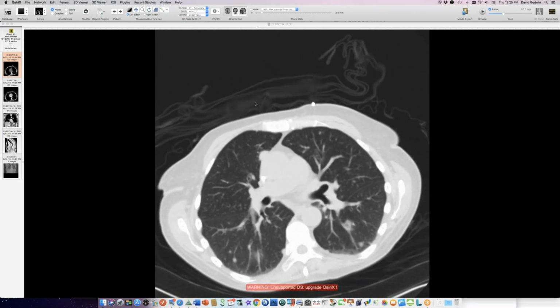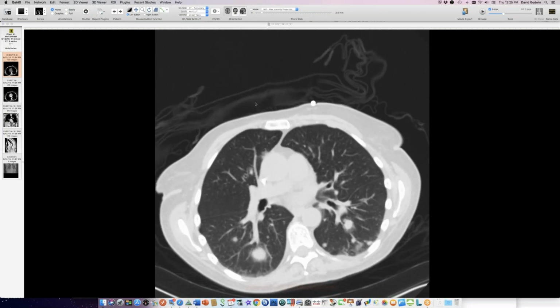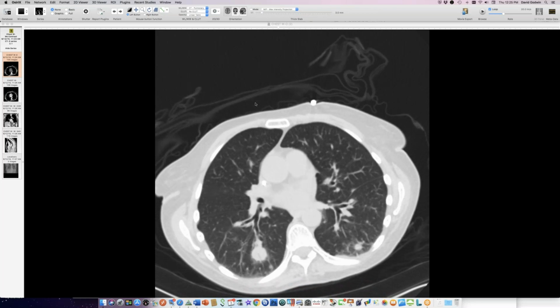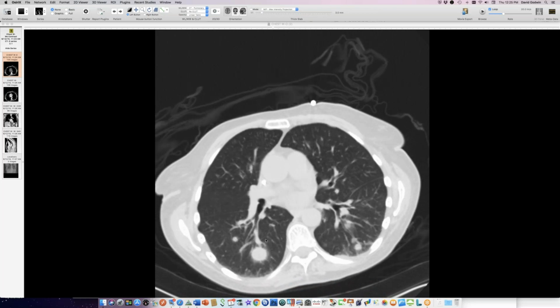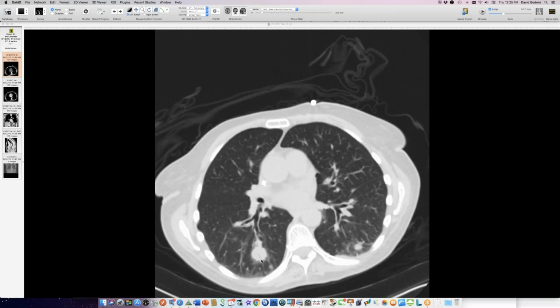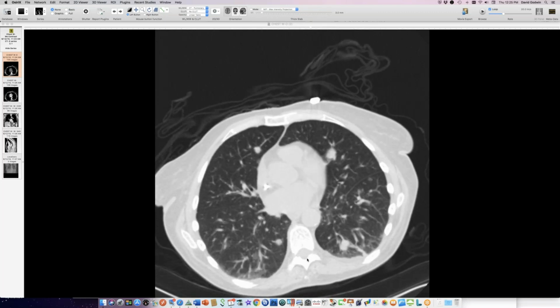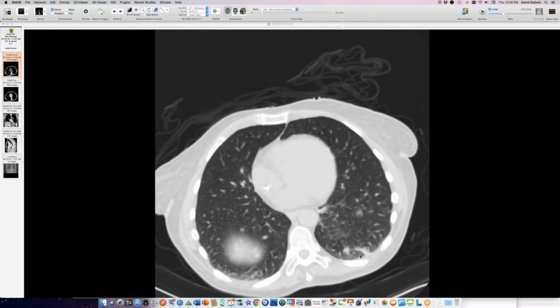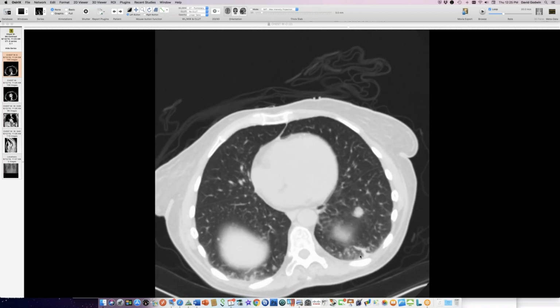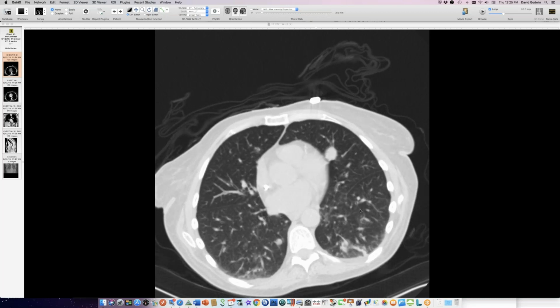that shows these nodules. And the first consideration for somebody who is immune compromised by Rituxan and other things would be fungal infection, but these really don't look like fungi in terms of their basal predominance rather than their mid-lung predominance. The associated air bronchograms, the large number of lesions here, the fact that some of them are getting fairly peripheral, and this one's, for instance, right on the bottom surface of the lung. So I believe that the lung lesions are also PTLD.